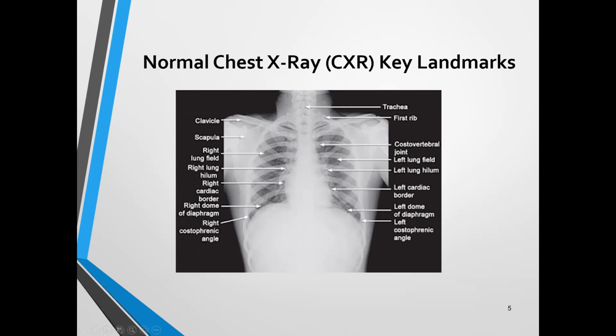What you'll see in some of the slides that we go over, for patients that are air trapping, like the asthmatic who's severely air trapping, is that those angles are flattened. As they go in a medial fashion towards the center of the body, they normally angle upwards, but you won't see that angle up like that.